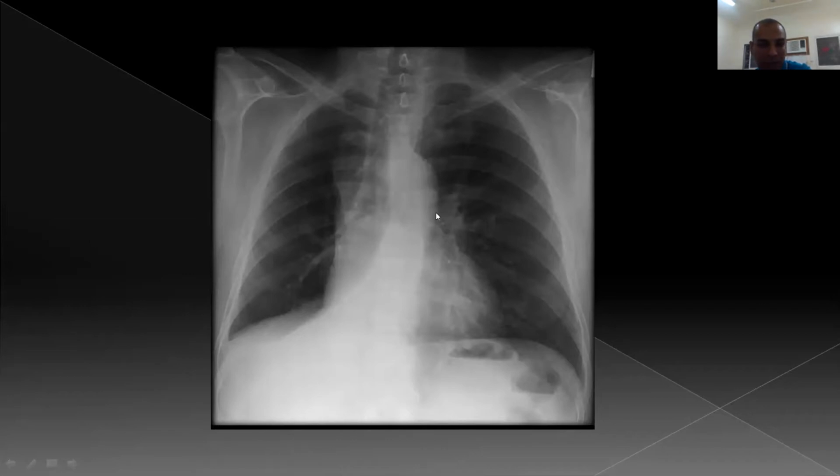You should see the hilum similar and bifurcating. This one doesn't mean middle lung lobe collapse. Why? Because the middle lung lobe collapse will affect the right cardiac border. The right cardiac border will be obscured, while the right lower lobe collapse will obscure the right diaphragmatic copula.